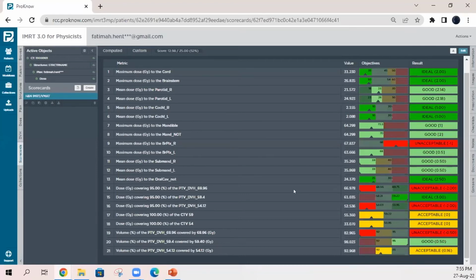then my score was bad. And as we mentioned before, in a lot of tricks, please use the rings, use the correct way of cropping your PTVs from each other, use your own optimization PTVs. For the gantry angles, for the arcs, I advise you to use 1 degree or 2 degree offset between the gantry angles. What does it mean? Let's say you started with 178 to 181 counterclockwise. The other one will be, instead of 181, it will be 182, 177. So make an offset of 1 or 2 degrees between the arc rotations.